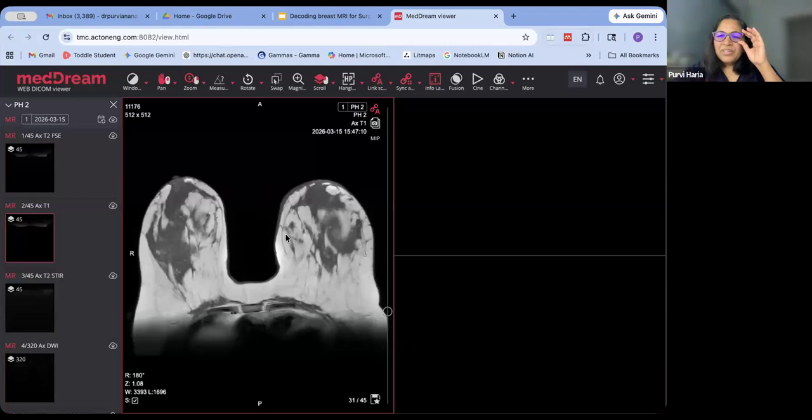Most of the time the breast fits inside. If it is too large, it fills up the anterior end or the base of the coil, and we see a contour change on the image, like it will become flatter here. Enhancement should not change, and it doesn't change.